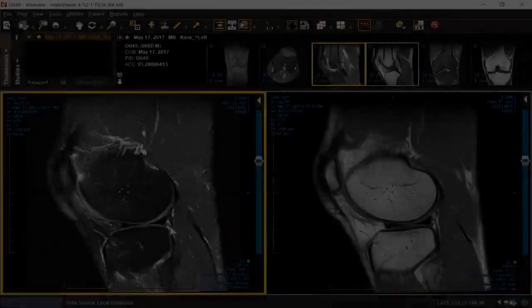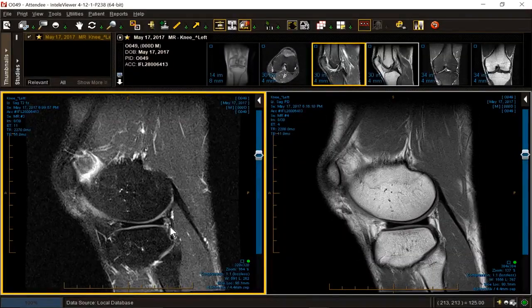And that allowed the meniscus to do this, to twist, and to also be pushed out when his leg was under flexion and he was pushing off that skate. Now, this signal on the inside of the meniscus, which is abnormal, was probed, it was sewn, but we believe it wasn't his major problem. It was probably secondary to the meniscus moving in and out, being hypermobile as a result of the loss of the tether of this inferior fascicle.